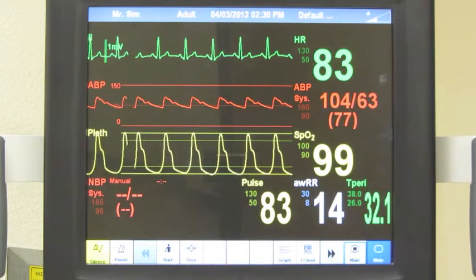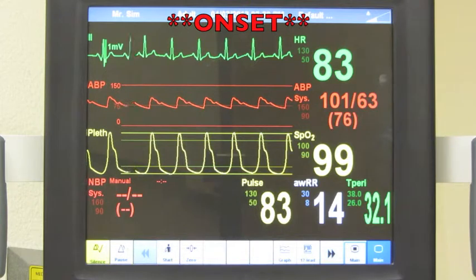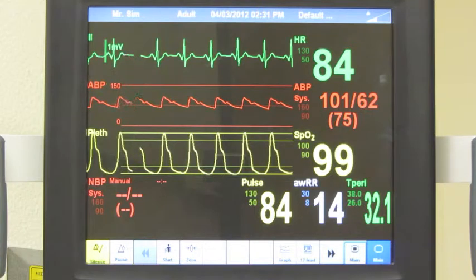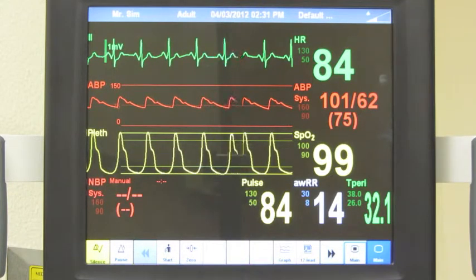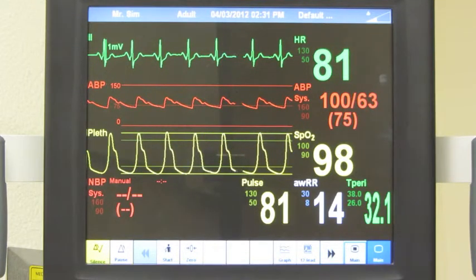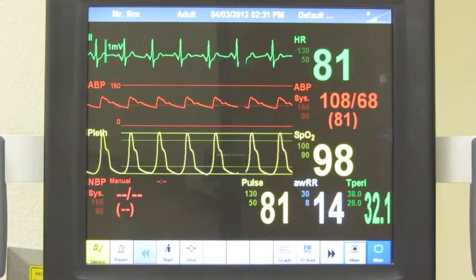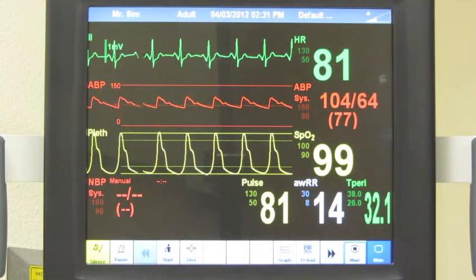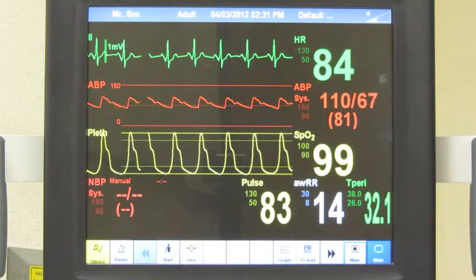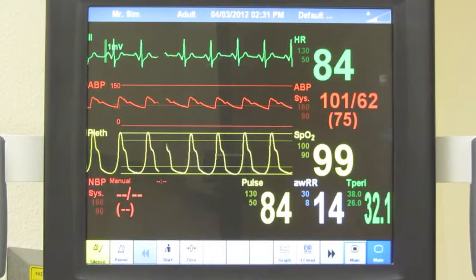You see on the screen before you now an example of ST segment depression. I want to remind you that ST segment depression consists of a horizontal or downward sloping ST segment that's depressed for at least 1 millimeter or more and has a depressed duration of greater than 0.08 seconds or 2 small boxes if those were on the screen. The depth and duration of depression is proportional to the degree of ischemia that the ST segment signifies. As a new finding, ST segment depression should be cause to discontinue the physical activity you're currently involved in.